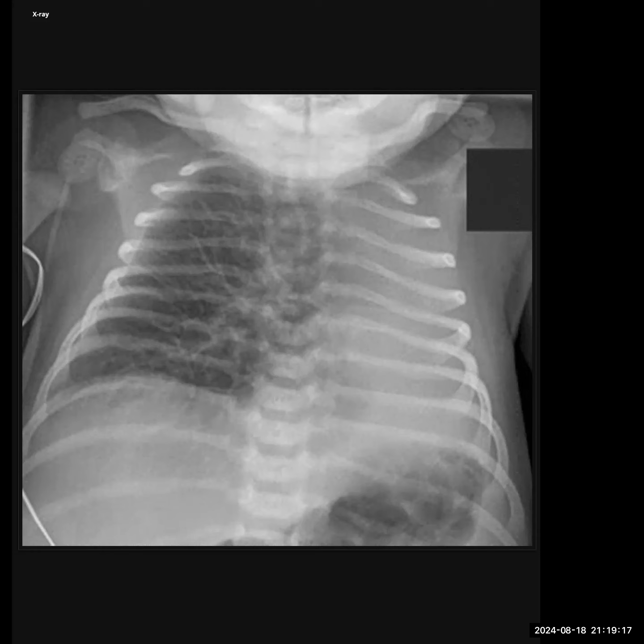Other than that, any vascular ring causing compression of the left main bronchus, such as left pulmonary artery originating from the right pulmonary artery, that would also cause this appearance. Do you expect that to cause this kind of imaging picture this early in life?